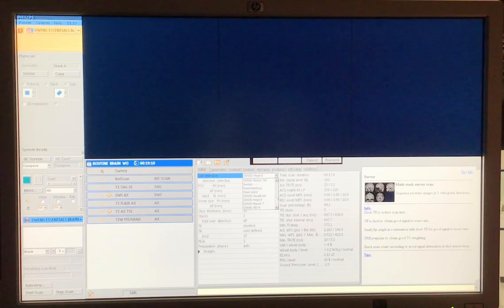Here is the sense head, which is 8 coils. There is a sense head that has 6 channels. And it looks like that's all the coils that are listed. And this is just a routine head coil, which is probably what your QA testing might be done on.